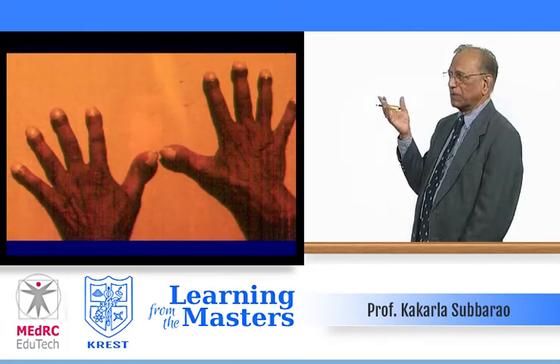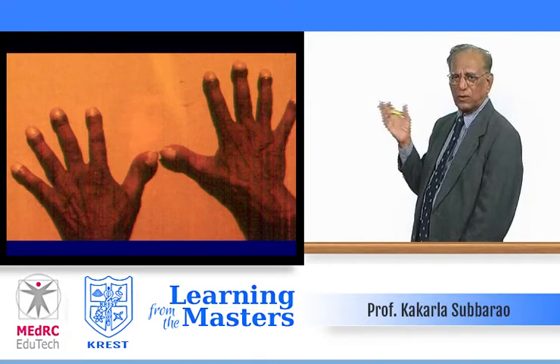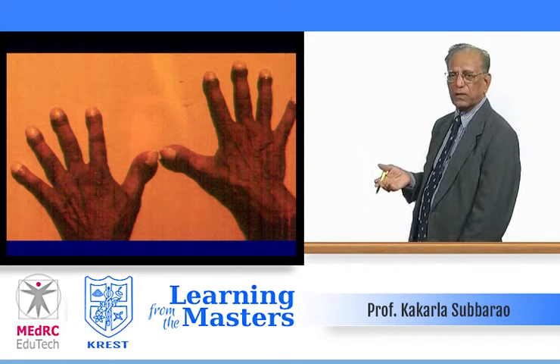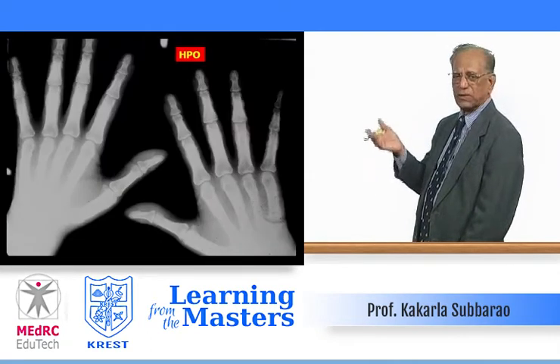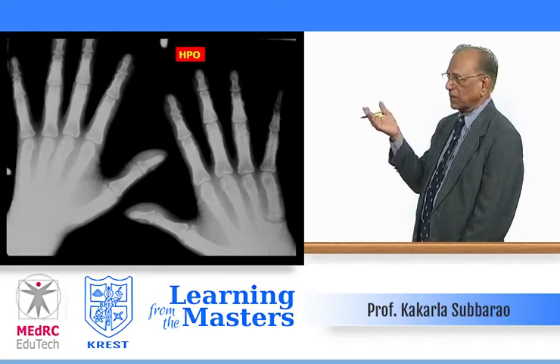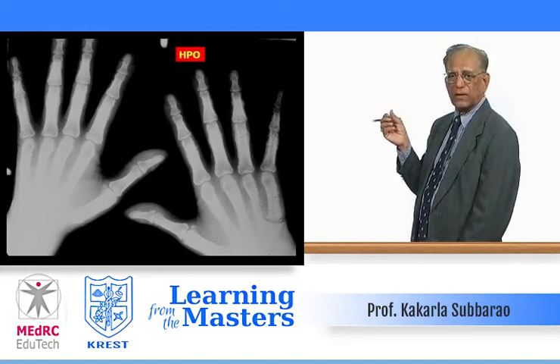Hypertrophic osteoarthropathy, or otherwise called clubbing, has various causes, not only pulmonary; cardiac and metabolic causes also can produce this hypertrophic osteoarthropathy. Diffuse periostosis of all the metacarpals and phalanges, but it spares the distal phalanges. It does not involve the distal phalanges.